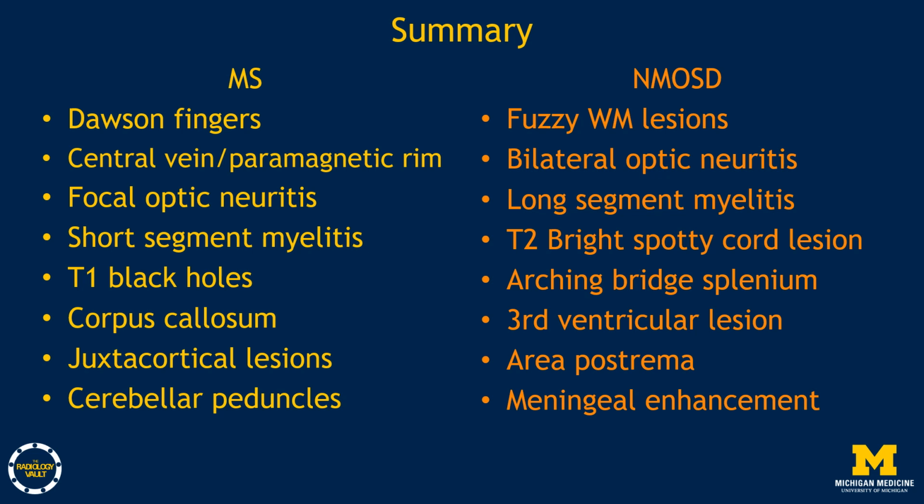The arching bridge splenium lesion as well. The third ventricular lesion is suggestive of NMO as well. Lesions of the area postrema are specific but infrequent. And finally, there are also reports of meningeal enhancement in NMO.